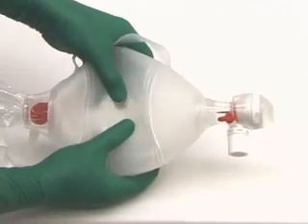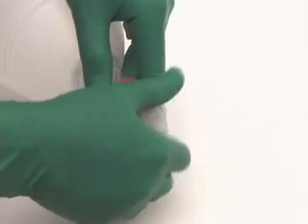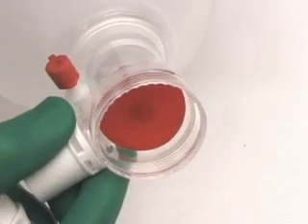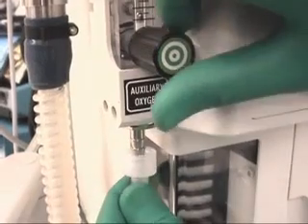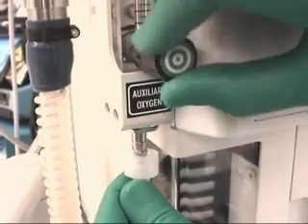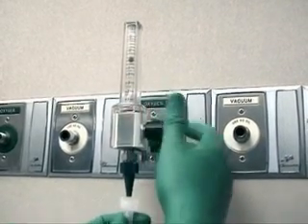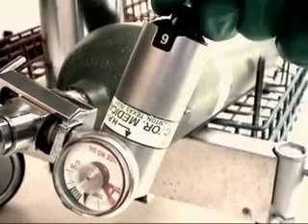There are a variety of bag valve designs available. All have a self-inflating bag and a non-rebreathing unidirectional valve. The valve is designed to function during both spontaneous and manually controlled ventilation. Because bag valve devices can operate without an oxygen source, it is important to ascertain that supplemental oxygen is flowing through the bag valve device when indicated and available.